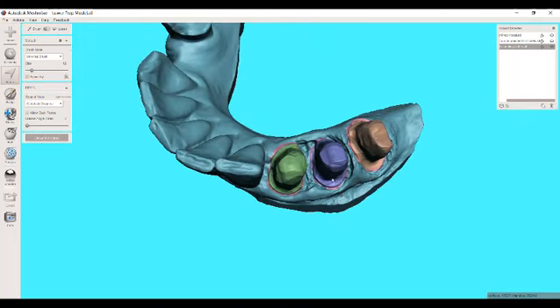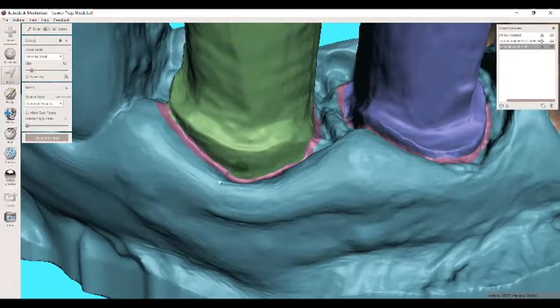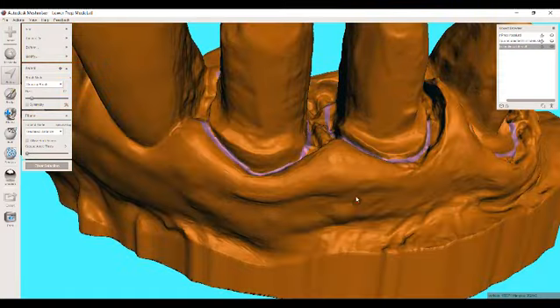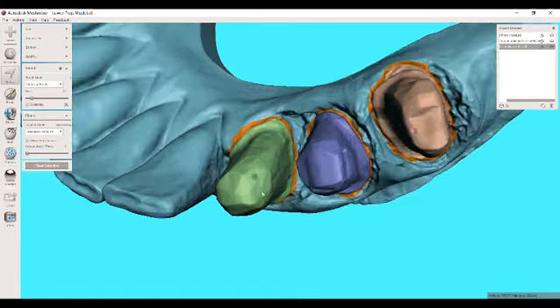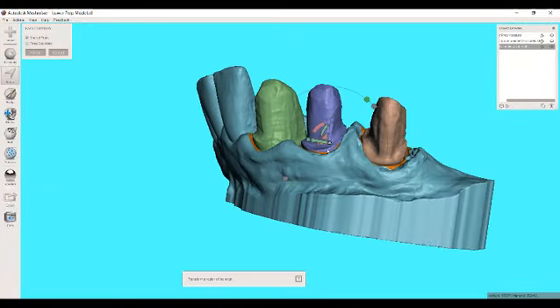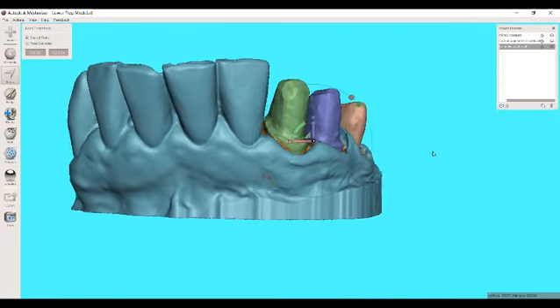Okay, so what makes this process easy is breaking it into face groups. Okay, so now I just want to select all of these. That has selected everything but the pink area, and now I'll hit invert just because that to me was easier than trying to make a small dot size and click right on that pink. And with that done, I'm going to hit T for transform, and I'm going to pull this straight down.